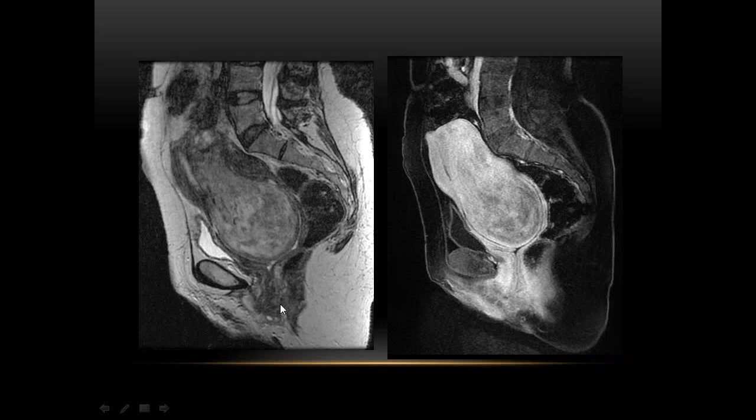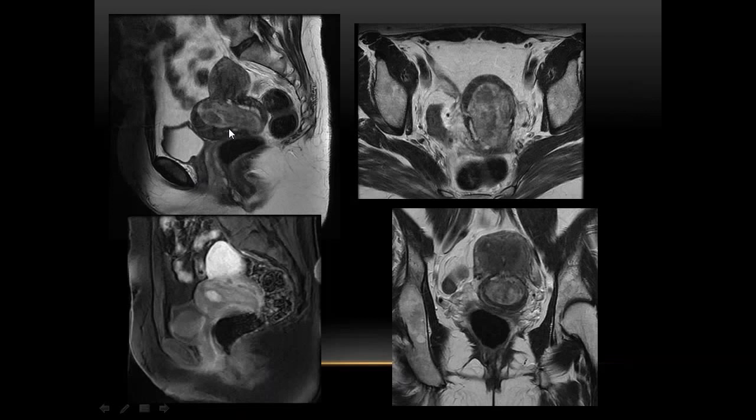So how they had to remove this was transvaginally. They removed a portion of it, then they went up and took the rest of it out by the stalk. This is another example of how this submucosal fibroid became intracavitary and expelled, and now it is expanding the cervix. What happens is if there is an increased risk after UFE, and this does occur, it can necrose and become infected and require emergent hysterectomy. So it's important to discuss this in your report where they are located.